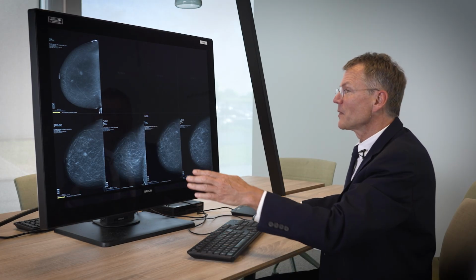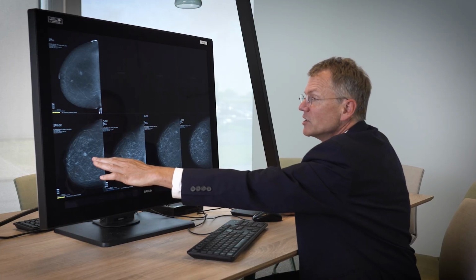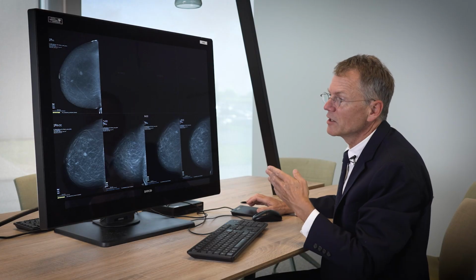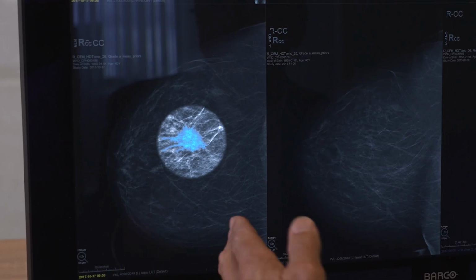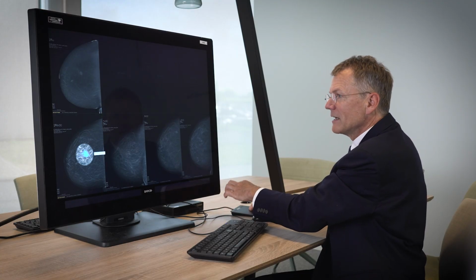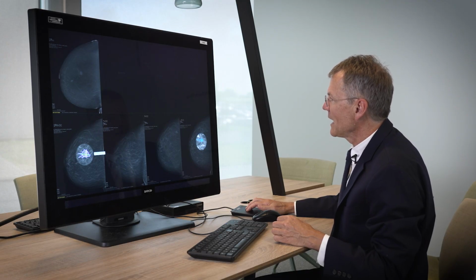So in this case, I have a number of years of images. And so for this lesion here, I'd like to measure that and compare it to what it was like in the prior years. So I can turn on the spot and I can go to this one, and then I can measure that by putting down my fingers. And now using the second button, I can get a second spot, and I can bring that over here, and I can look at the same lesion, and then I can measure what it was like then.